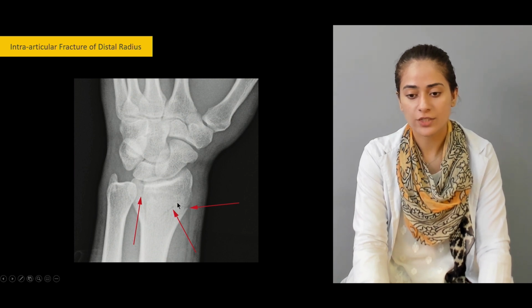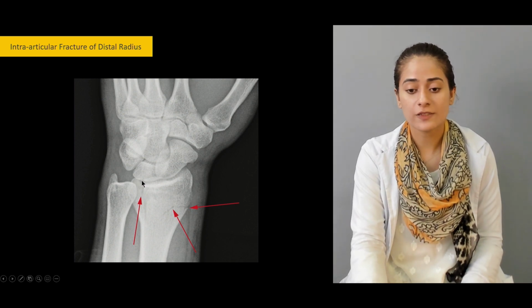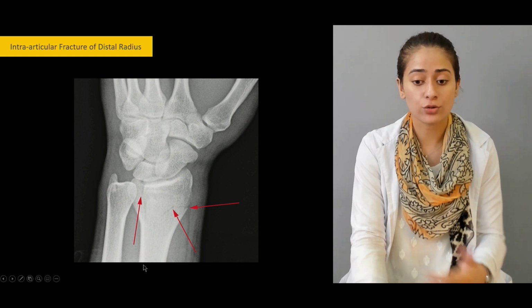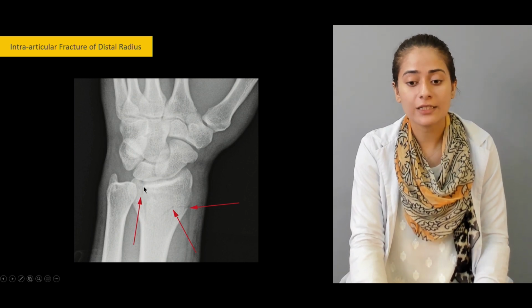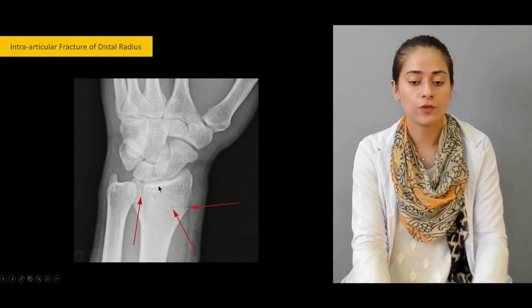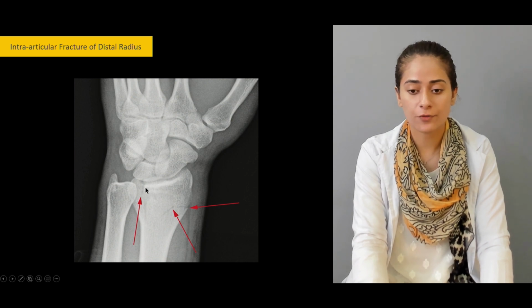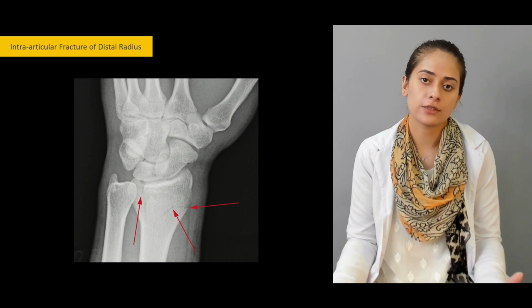So if it were a fracture here to here, then we would have called it an intra-articular fracture, like this one. So this is an intra-articular fracture because it's a fracture of the neck, or even, if it extends to the shaft, it can be a fracture of both the neck and the shaft. But because it is going inside the joint capsule, or is also including in the fracture the intra-articular surface, we call it an intra-articular fracture. And because this is not involving in any way this surface of the joint, we call it an extra-articular fracture, or outside the joint fracture.